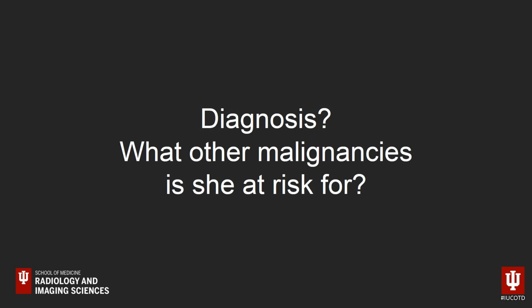Okay, 2 questions for you. First off, what's the diagnosis? And then the second question is, what other malignancies might she be at risk for?